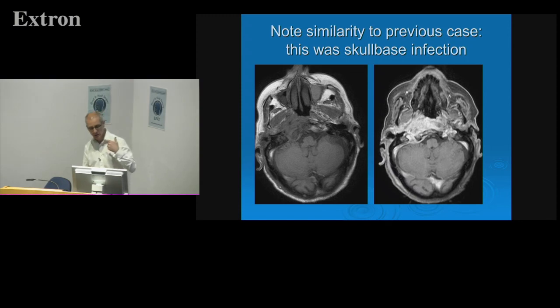This is just my last slide. This is a skull-base infection. What can I say about this? It can look like lots of these tumours at the skull base. So I guess it's about the history of the patient. Is it an elderly diabetic on medication? Is it someone who's already been treated for otitis?